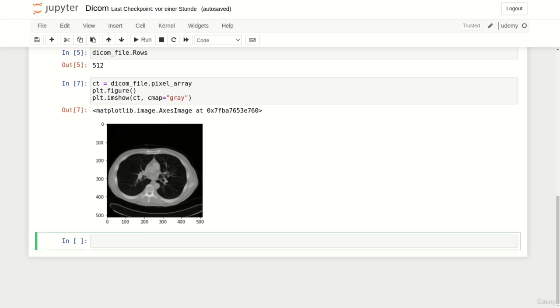Cool! Now, after learning how PyDICOM works and how we can use it to load a single DICOM file, it is time that we take a look at our first real-world three-dimensional example. In fact, we will inspect a head MRI scan provided by Sinudo. We again provide the dataset in the corresponding directory. So, let's get started. At first, we need to define the path to the head MRI scan. Instead of using a plain string, we are going to create a path object.